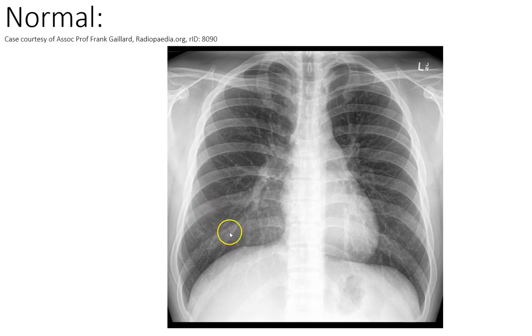The sixth rib should bisect the hemidiaphragm, counting from this lateral aspect as it's coming around the front. And if I do it on the other side, 1, 2, 3, 4, 5, 6. We can even squeeze in 7 and 8. I think that's indicating this is somebody who's able to take a really big deep breath and hold it. In other patients, you might think it's a sign of hyperinflation, for example, in somebody who has COPD or asthma.